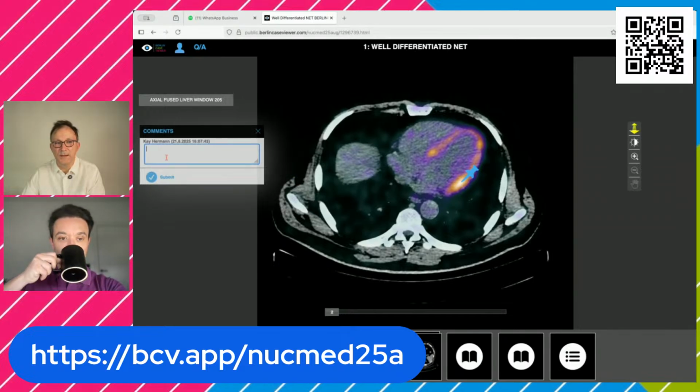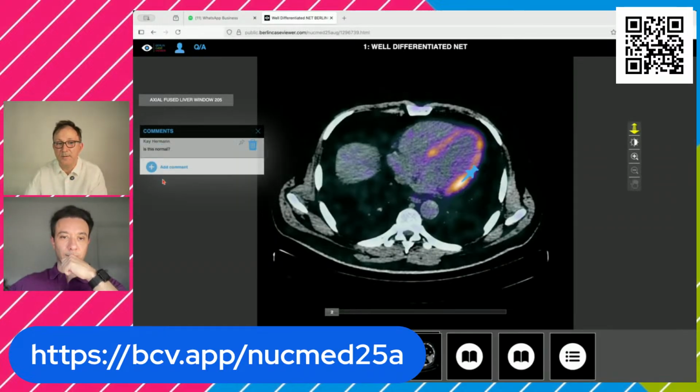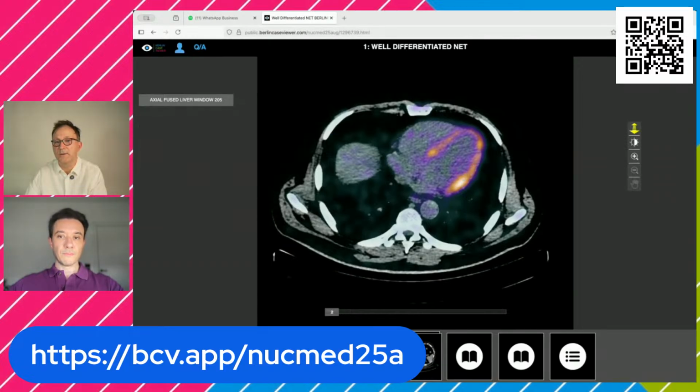Confirm this pin, and then you can ask, is this normal or something else? So this is really interactive, and you can ask pixel by pixel and learn, and you see we can see what you did ask, and we can answer it in our stream.